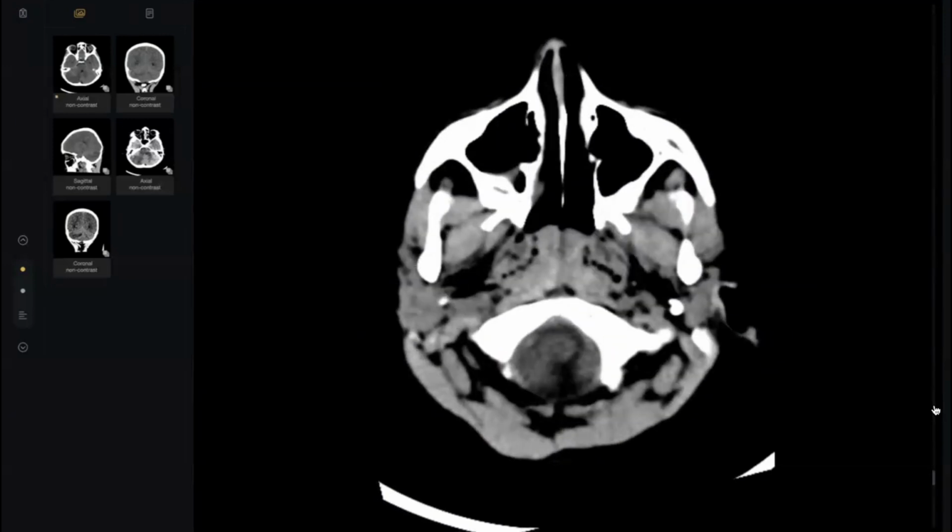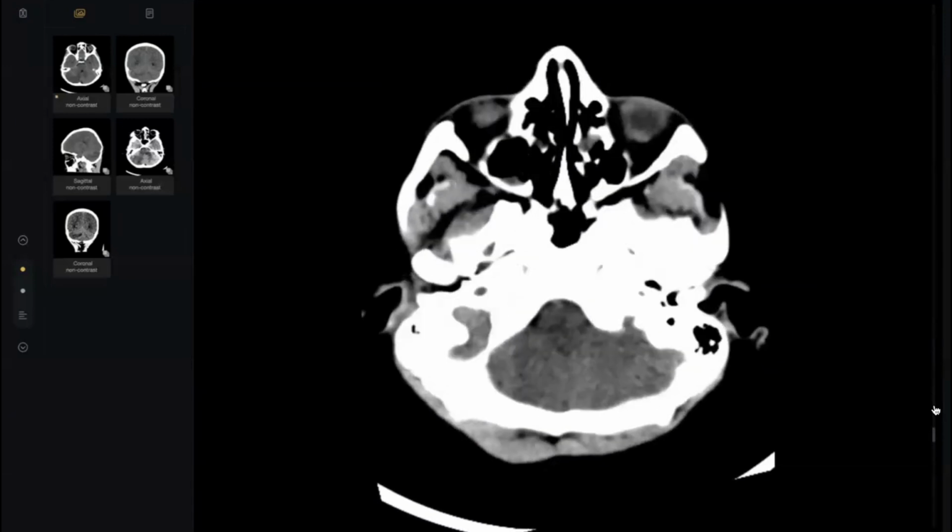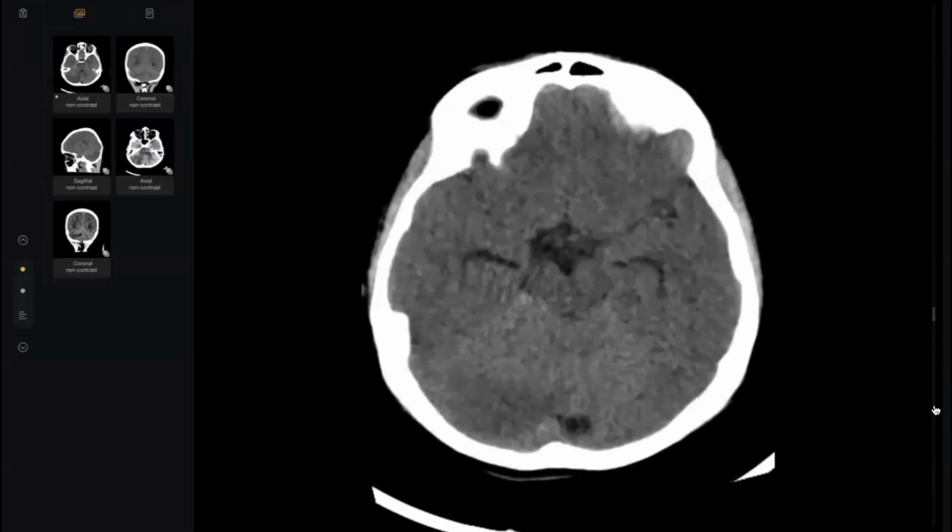So I'm scrolling from bottom to top. First, I will review all the findings and then I will comment.